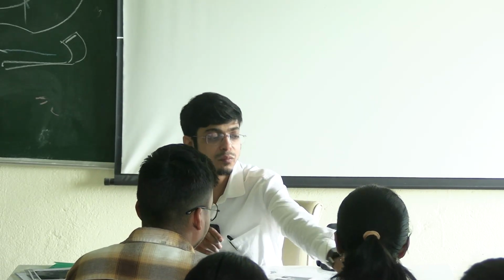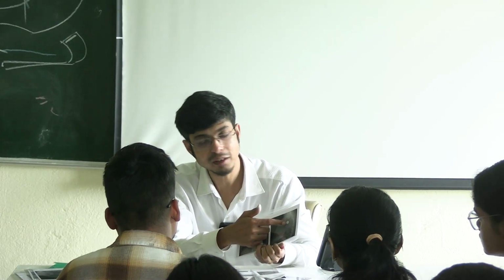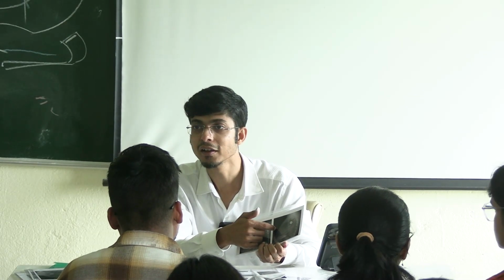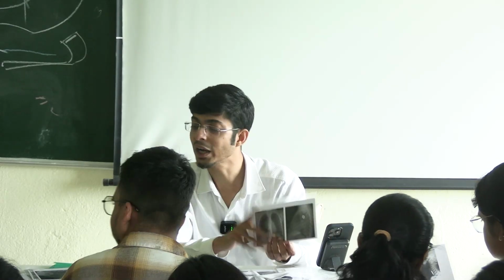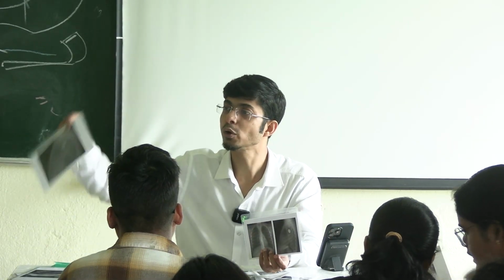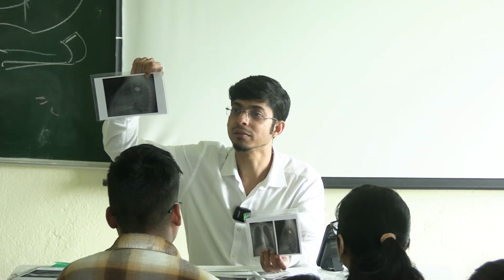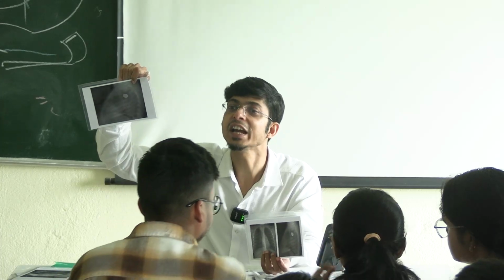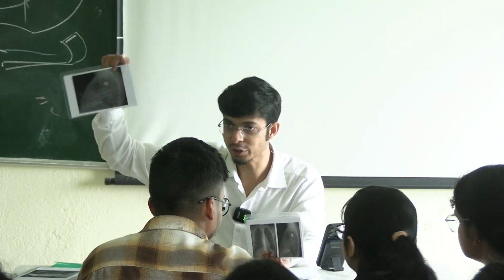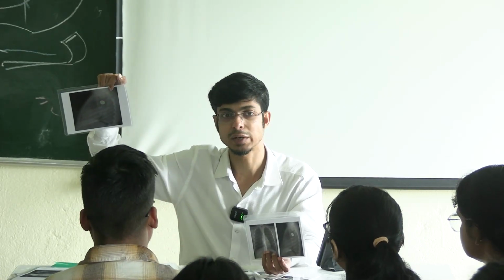So you have both the views. If it was outside, on the lateral image, you should have seen it outside. It cannot be. I mean, this is very clear cut. On one image, you may not be able to see. If you are only given this image, then you cannot say that this is definitely in the esophagus. So if they ask you, tell them that we'll need another X-ray. If this is a lateral view, we'll need an AP view to confirm, sir.